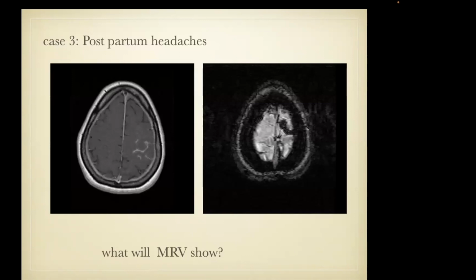But this is an example which shows the benefit of the MR over CT is the visualization of this kind of dark worm, which is the thrombosed cortical vein in a patient with isolated cortical vein occlusion and not dural sinus thrombosis.